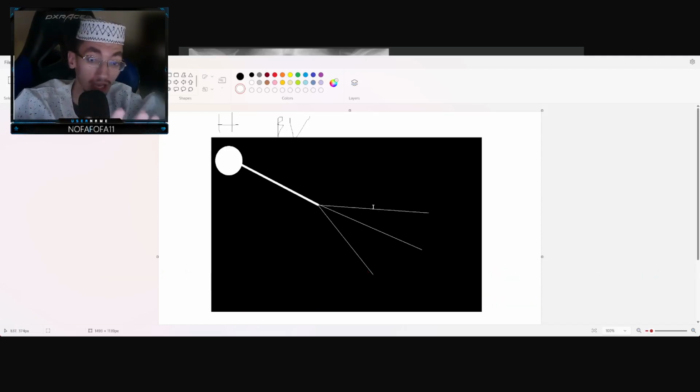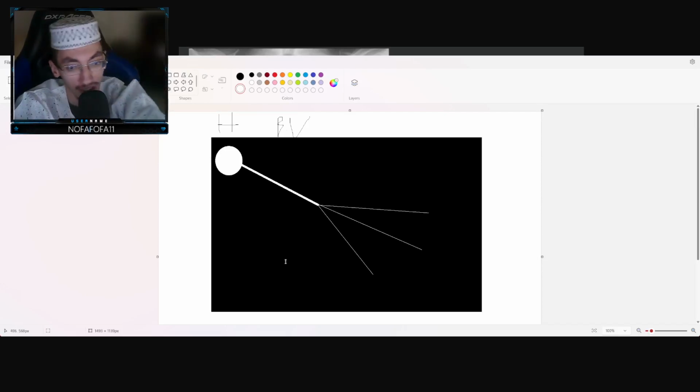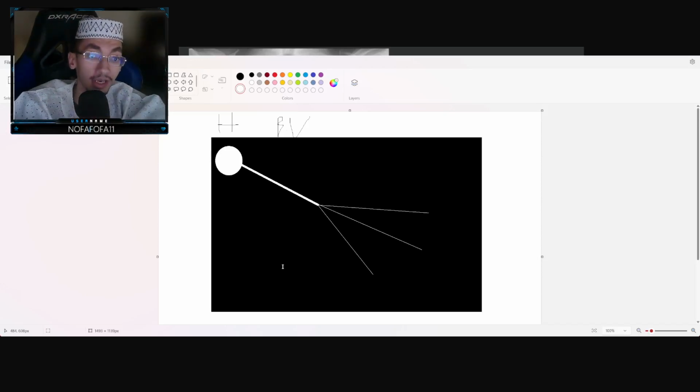Now, in between each pulmonary blood vessel are alveoli. You see this black background? That's air. Air appears as black, as lucent on a chest X-ray. And what structure contains air? Alveoli. So in between each pulmonary blood vessel are alveoli containing air.